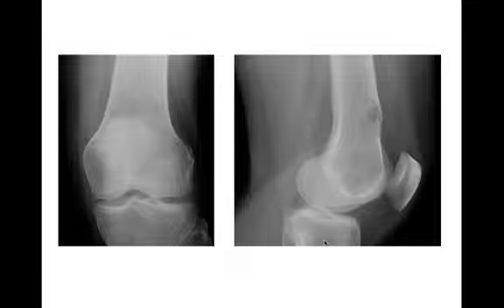All right, two views of the knee. Really best, I think, to localize it on the lateral view, which shows you this is actually a cortically based lesion, geographic lytic lesion, narrow zone of transition, has a sclerotic border as you can see on the frontal radiograph. And this one turned out to be a chondromyxoid fibroma, a rare benign tumor, but just an example of a cortically based lesion in this case.